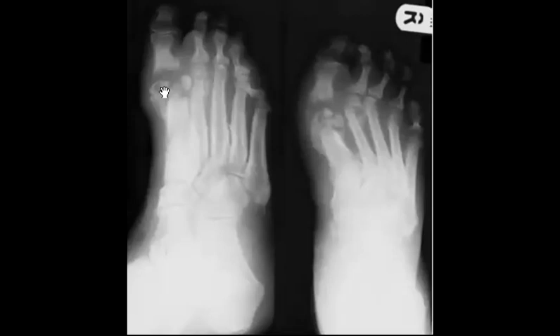You remember the D's: destruction and some osteopenia, the demineralization. So the first title for you in the differential diagnosis should be neuropathic joint, or Charcot joint. Maybe due to diabetes, so you'll ask in the history about diabetes.